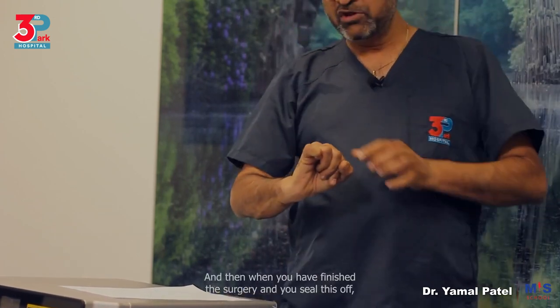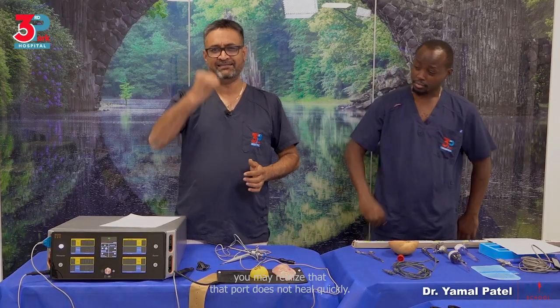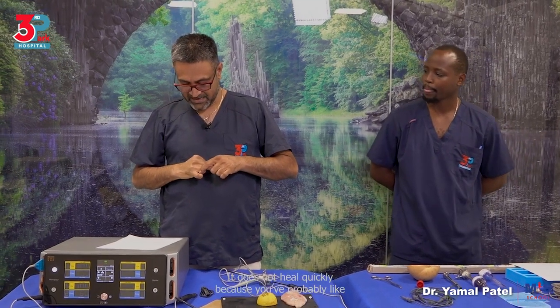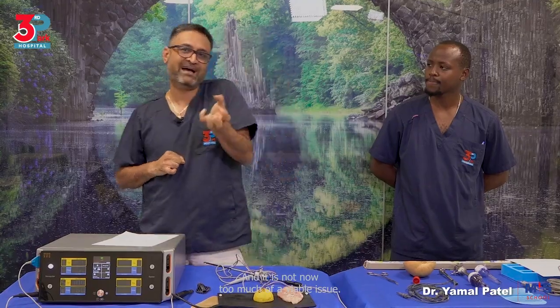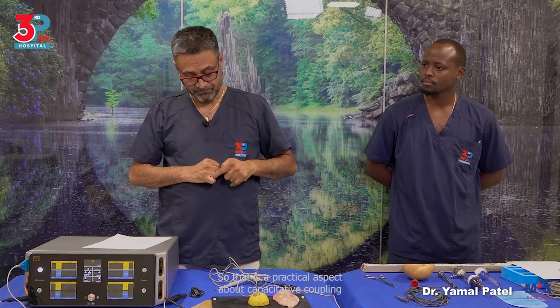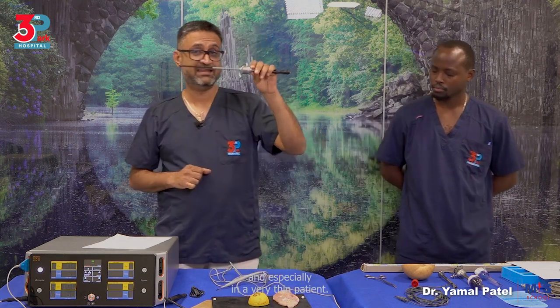And then when you have finished the surgery and you seal this off, you may realize that that port does not heal quickly. It does not heal quickly because you've probably burnt up part of it and it is now not much viable tissue. So when you're trying to stitch it together, it won't heal that quickly. So that is a practical aspect about capacitive coupling, and especially in a very thin patient.